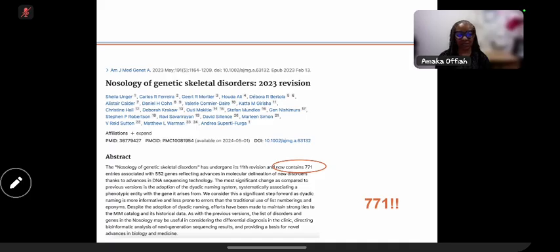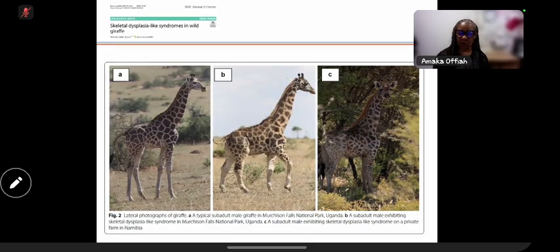So this talk is about giving you an approach that will help you narrow down at least to a group or a set of groups of conditions that you think the patient in front of you, the imaging of the patient in front of you, might be representative of. So generally speaking, it's all about pattern recognition. And if you can identify which aspect of the child, which aspect of the radiograph is abnormal, you at least have a beginning. Is the child overall small but proportionate?